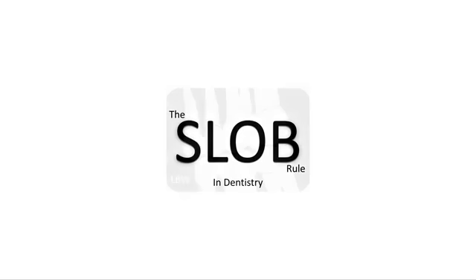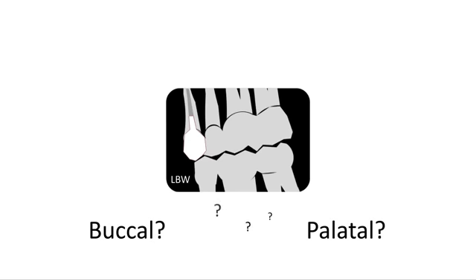Let's dive in. Here is the left bitewing, and as it appears, the upper left 4 is post-crowned. But can we determine which canal the post is engaging in? Is it the buccal or the palatal? When two roots are superimposed on the radiograph, it is difficult to evaluate them both.